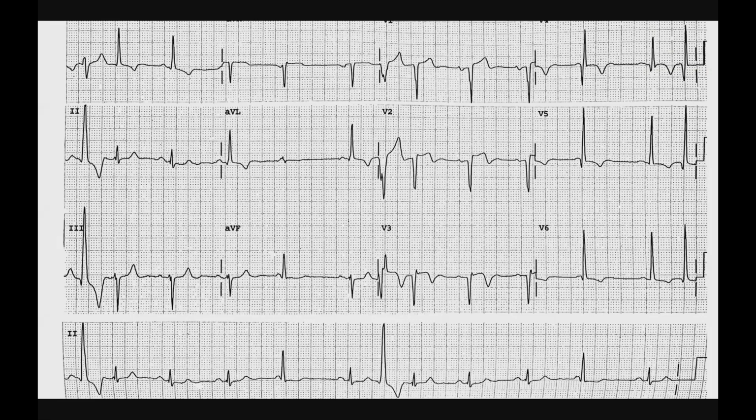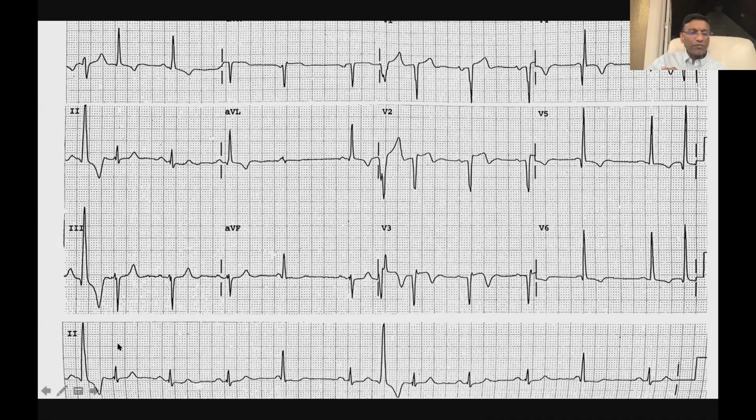You flush once, you've got to wait till you flush again. So think of that as your refractory period. So you have QRS here firing from your PVC focus. Next one should have fired here, did not get a chance because the ventricle is refractory. And then this one fired, again, the PVC focus fires, the parasystolic protected focus.